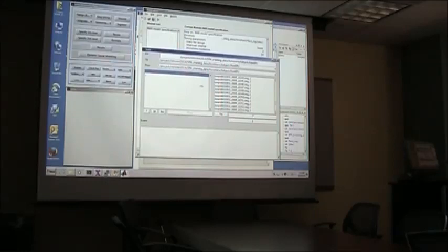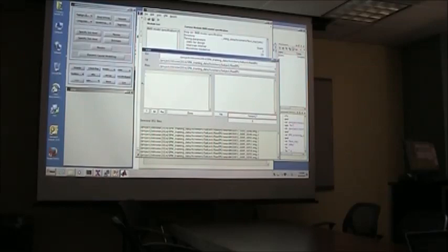As I mentioned, SPM puts a prefix after each processing step, and this last step is the smoothing, so they start with an S. I showed last week you can make sure you only select these files by entering this, so you're only selecting files that start with SWARS.